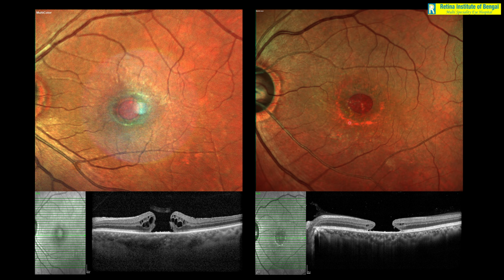If you look, however, at the multicolor image of the macular hole on the right hand side, you will see there is no greenish hue. So this absence of greenish hue tells you that these edges are not cystic, which is confirmed again on OCT. These are atrophic edges, and you can see that there is this reddish tinge instead of the greenish tinge, which further confirms the presence of atrophy and RPE loss. It tells you that even if you somehow close this hole, which may not close easily, but even if you successfully do that, still the chances of vision recovering in this particular case are less compared to the one on the left.